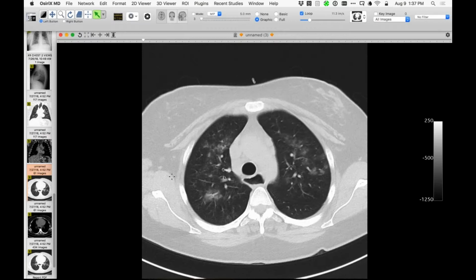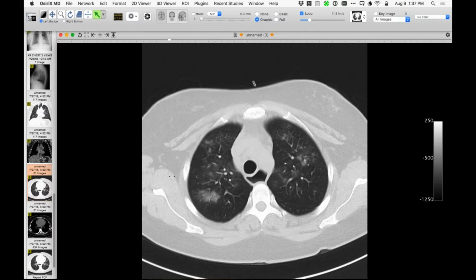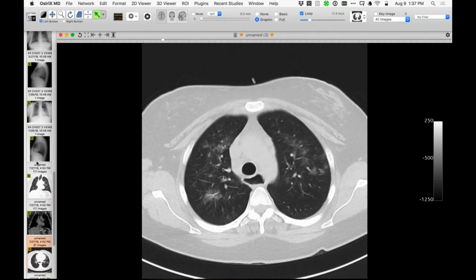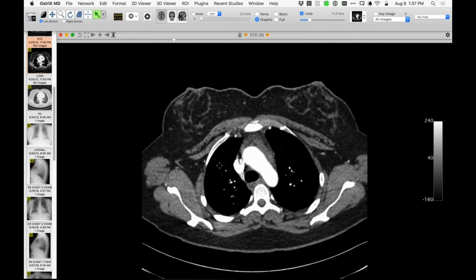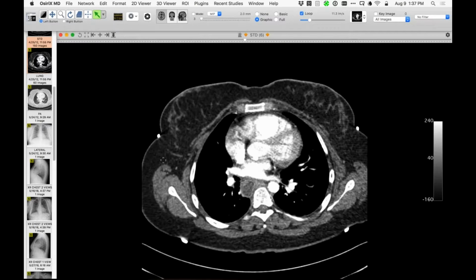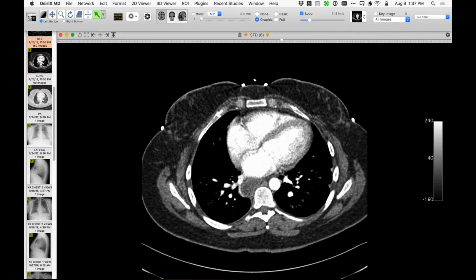So Howard, the CT scan interpretation didn't mention the abnormal esophagus? On the remote CT from 2012, I don't think it did. Let's see how abnormal that is in 2012. You know, it's not as distended there. There's a bit of air. There's a bit of fluid there. I don't think it mentioned it particularly. I can't remember for sure about this. Okay. But it certainly wasn't mentioned on the radiographs.